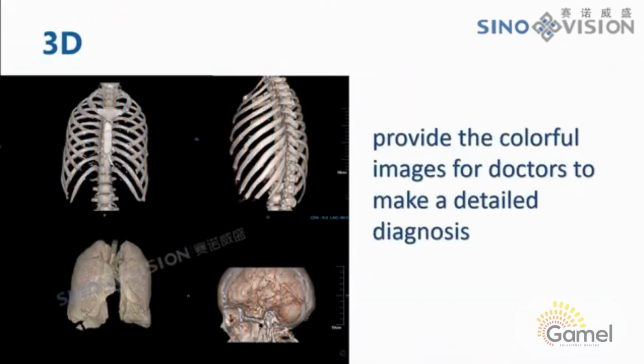Volume rendering technique, also known as VR, is to reformat the thin layer exam data three-dimensionally and generate colorful stereo images. The color rendering in this software is vivid, according to the needs and operator preferences. The colors can be edited and configured. The anatomical structures are rendered three-dimensionally and intuitively, which helps to avoid the trouble of using 2D images to imagine three-dimensional space. It assists clinicians to locate quickly and accurately and make the diagnosis.